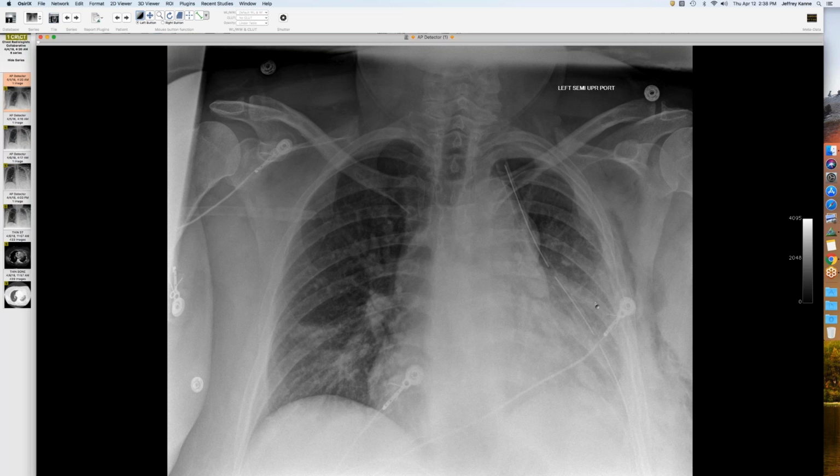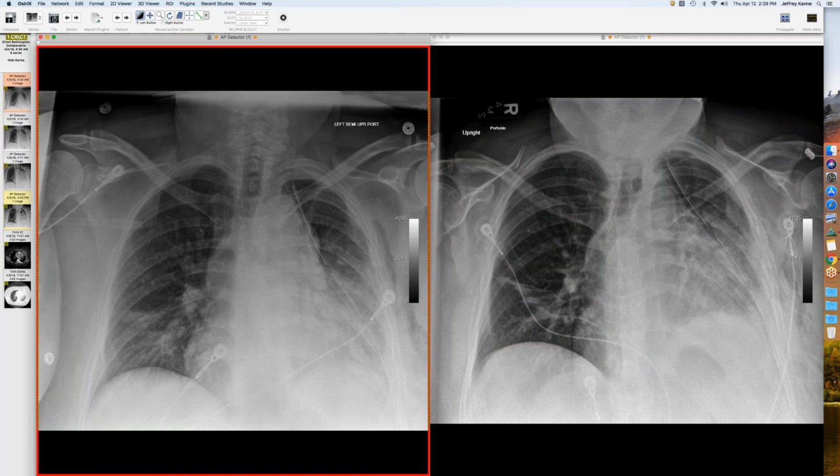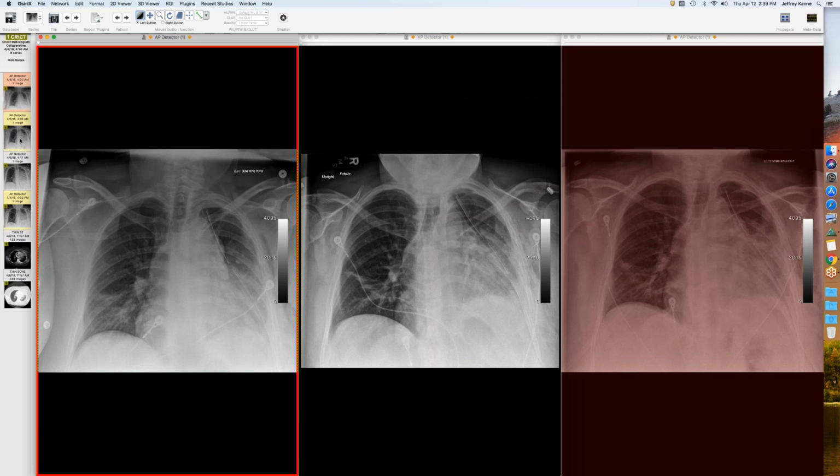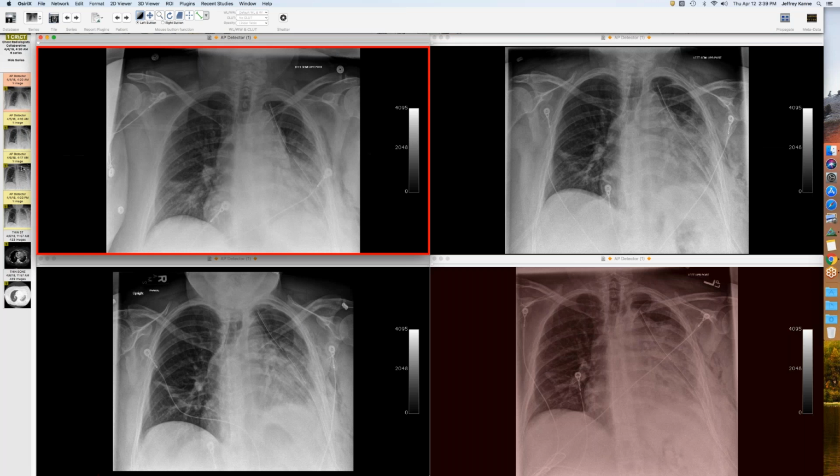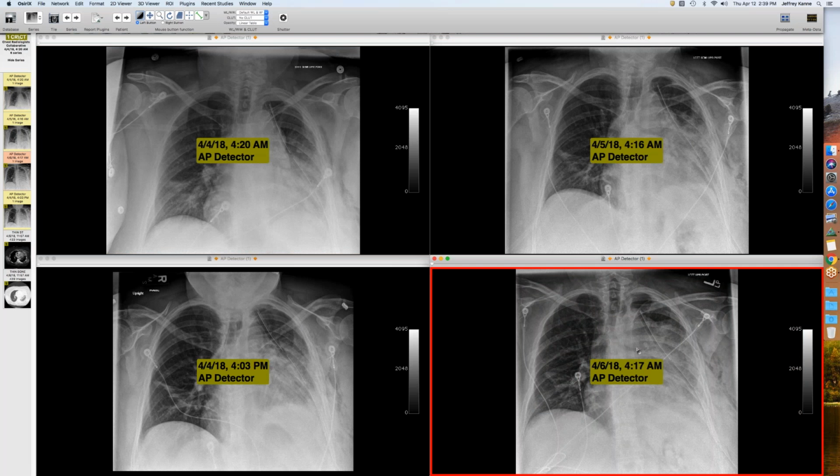She's already partially upright. And then what happened over progressive days, so this was her later the same day, about 12 hours later, and you see smaller volume on the left, it's getting a little denser down that left lower lobe. We'll jump ahead another day, and we can see it's not clearing up. The pneumothorax is persisting. And then finally, I'll jump ahead another day after that. There we go. So progressively getting denser here. So the question was, what could be going on?